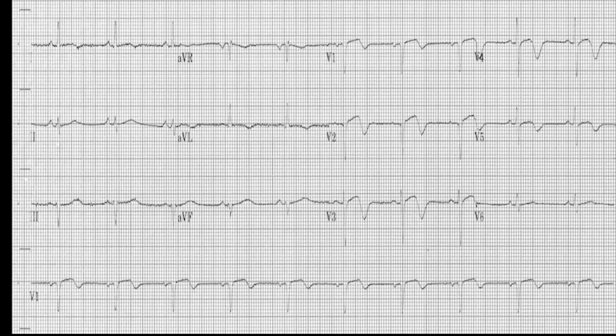In this ECG we have, can you say, is it a biphasic T wave, right? We have biphasic T waves in V2, V3, V4, and even V5. That is right. That is again the proximal LAD critically occluded, critically compromised. Go directly to angiography, not for the echogram, right?